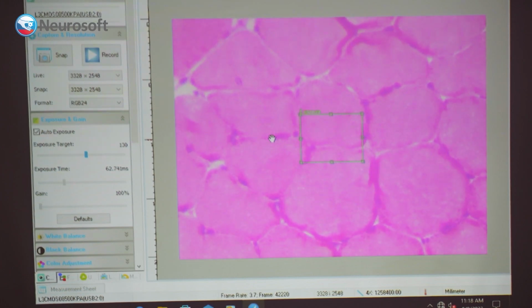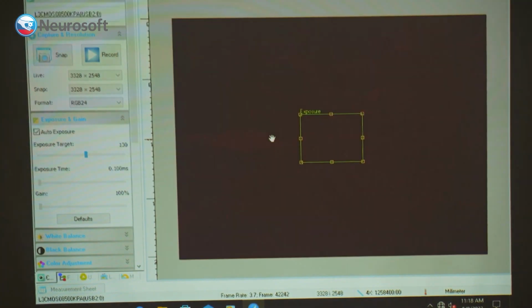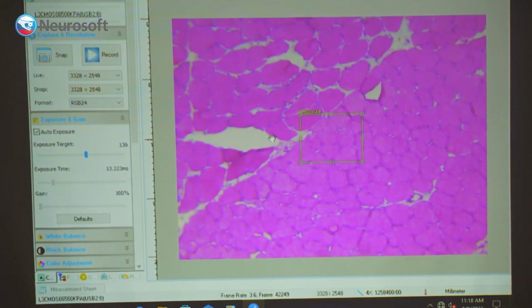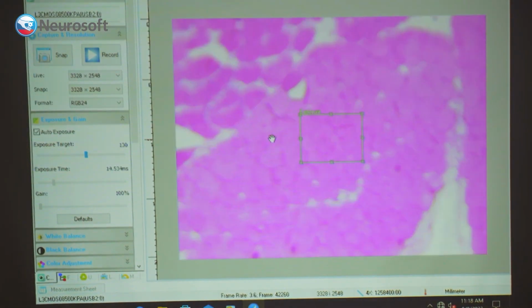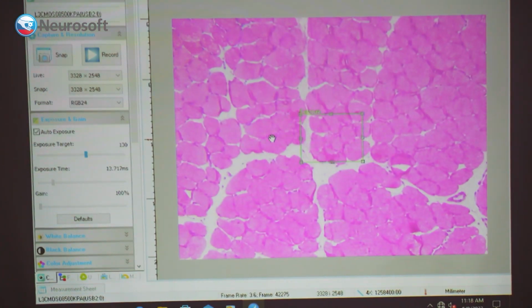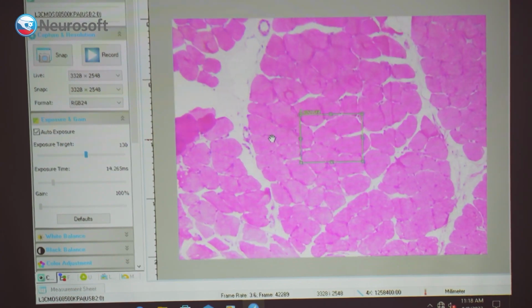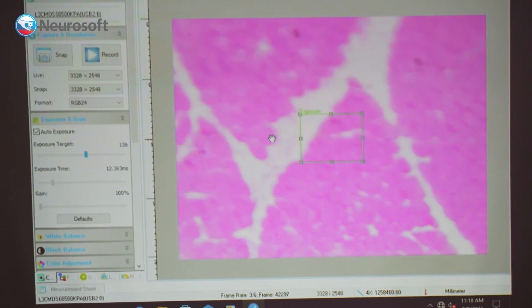Group atrophy? No. In myofibrillar myopathy, you get this. What is that called? The focal. I thought that I saw some focal staining, like a protein cytoplasmic aggregate, bodies. No, no. I checked modified Gomori trichrome, but I didn't see anything. Okay.